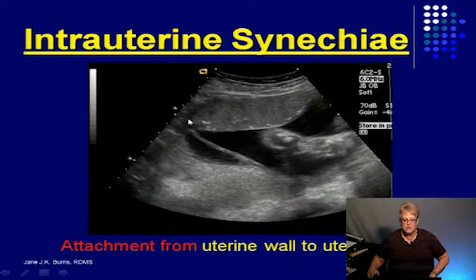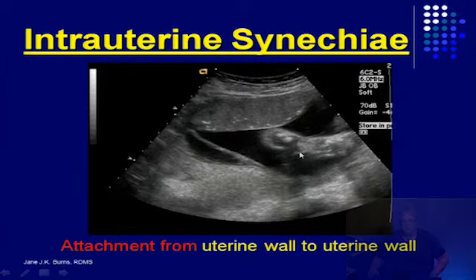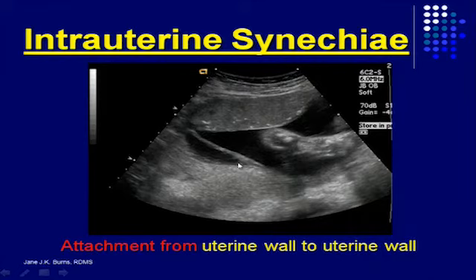This one was the uterine synechia. Look, placenta's here, but this goes to the uterus. And she had had some previous procedures done. So that's the difference. A lot of times you look at these and you're like, okay, where is it attached? That's what you need to know.